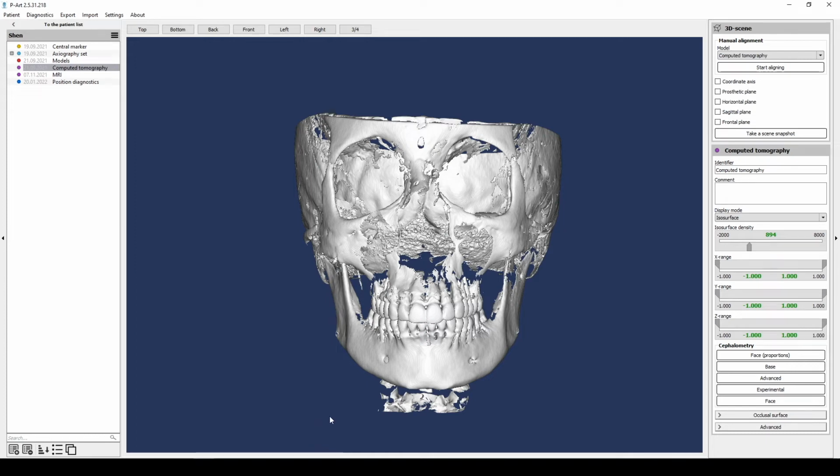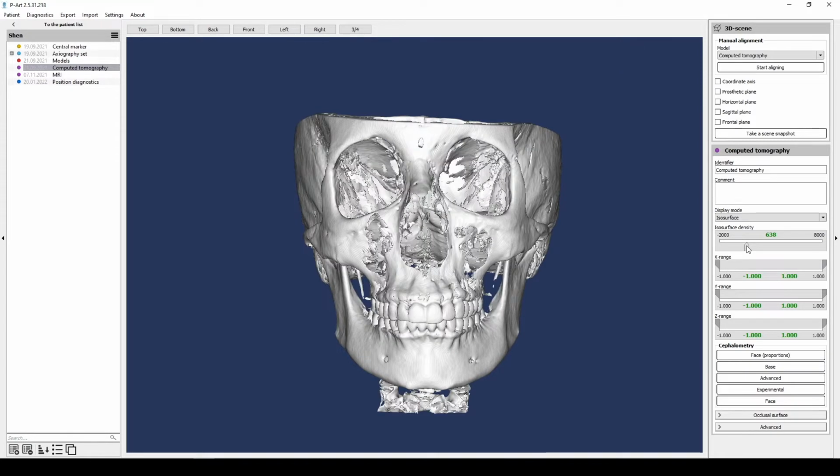Advanced cephalometry and anatomical planes. Anatomical planes we need for diagnostics, calculations, data export in modeling programs, and saving spatial arrangement. Which planes do we use for it?